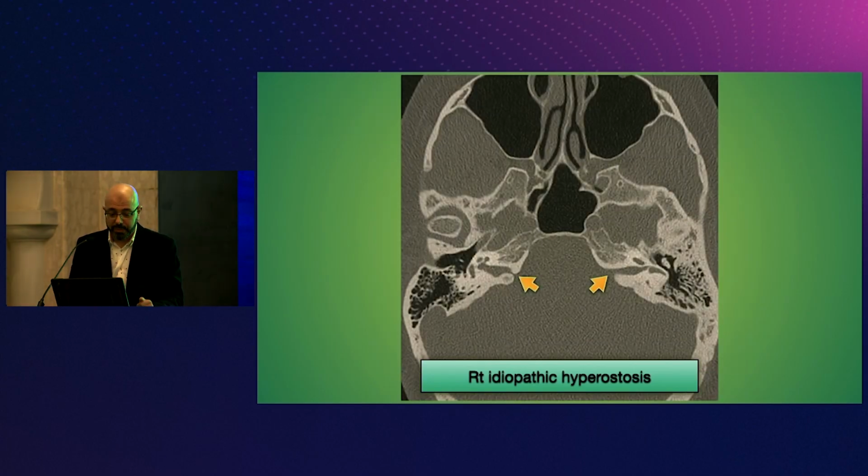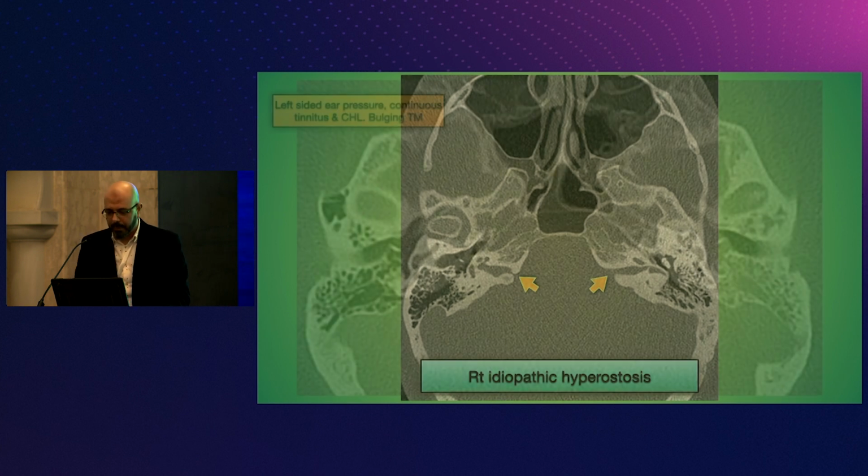And I'll show you the CT of this patient, because something like fibrous dysplasia can cause that as well. You can easily miss it on MR, but CT will give you more confidence to call it fibrous dysplasia or intraosseous meningioma. Metastases from breast cancer or prostate cancer can, again, have the same appearance on MRI, but CT will tell you whether or not the texture is normal or abnormal.